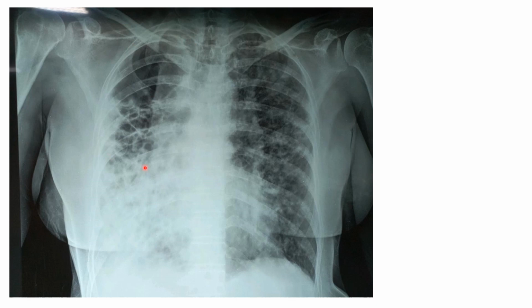Volume reduction on the right side, so fibrosis, this is a large cavity, see the avascular space, this lung is larger, big, and this cardiac shadow is up here, right? It is supposed to be somewhere here, so it's shifted to this opposite side. So this indicates the right side lung volume loss. You can also see the trachea getting shifted to the right.